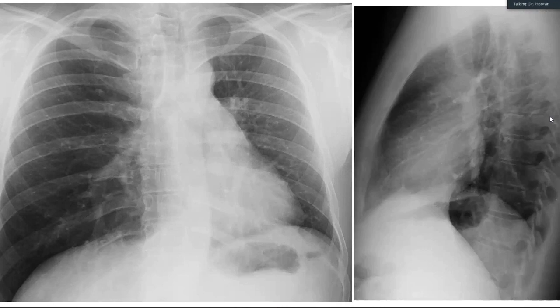Okay. As there is a technical factor due to which the right lung appears to be more translucent and larger in volume as compared to the left lung, I can also ask for any history, as the patient has a history of long cough. I can ask about any fever, weight loss, chronic infections, or allergy, asthma. And we can also retake the X-rays, or do any other investigation like HRCT.